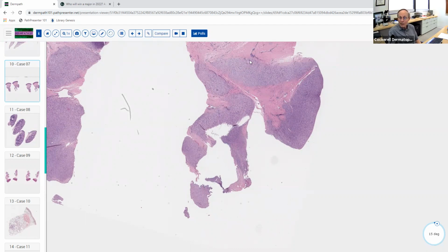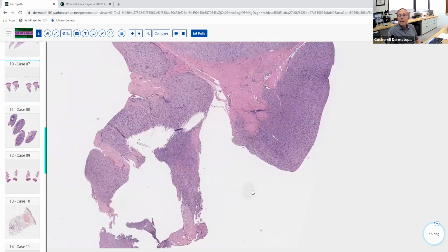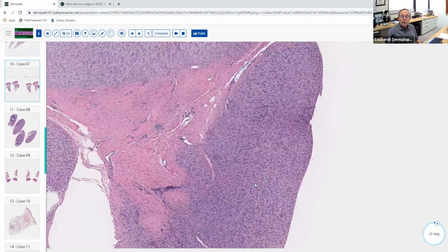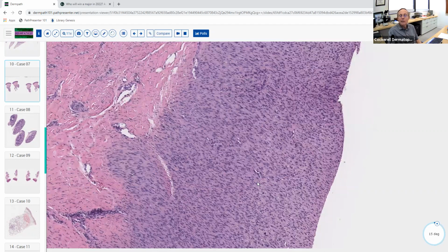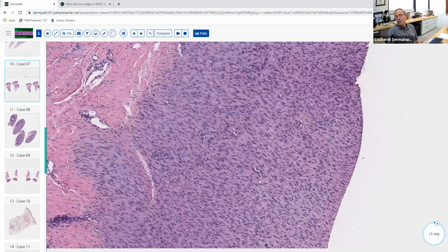But based on what we have here, this seems like a small little nodule aggregation. And if we say this is representative of the whole thing, it's got a nice smooth border to it. If you look at this one aggregation, it looks pretty symmetrical. So the little piece of the puzzle obeys the rules for benignity. And then, like you said, we go to higher magnification, and you don't really see any mitoses, pleomorphism, atypicality, anything like that. Do you think this is epithelial or non-epithelial?